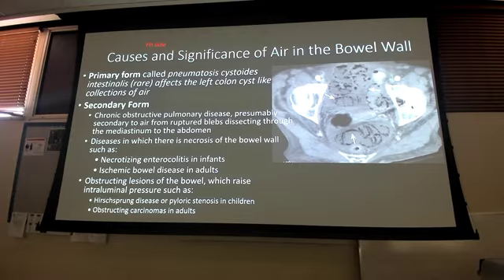FYI, right? You'll get this more, I think, in peds and probably GI, right? But you can end up having necrotizing enterocolitis in infants, ischemic bowel disease in adults. You end up getting this weird kind of mottled appearance. I don't even need to really draw it out. The white arrows kind of show it, right? That needs to be addressed.